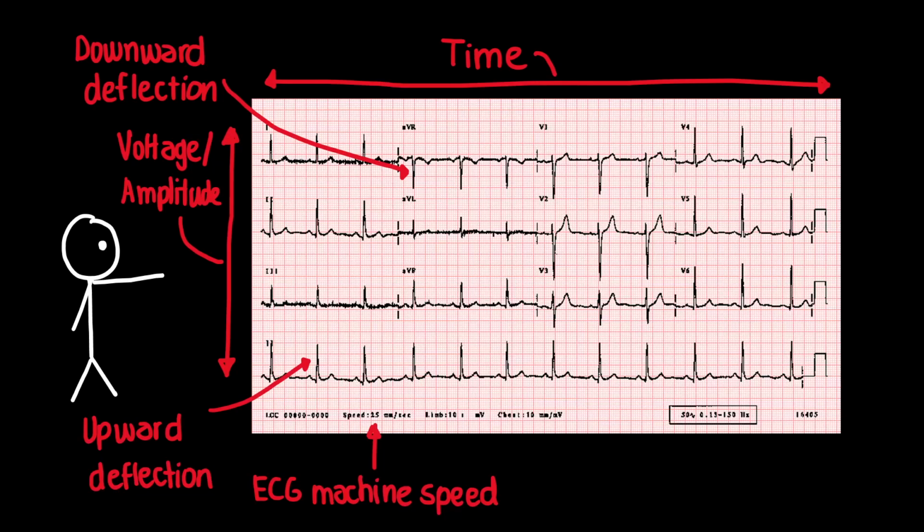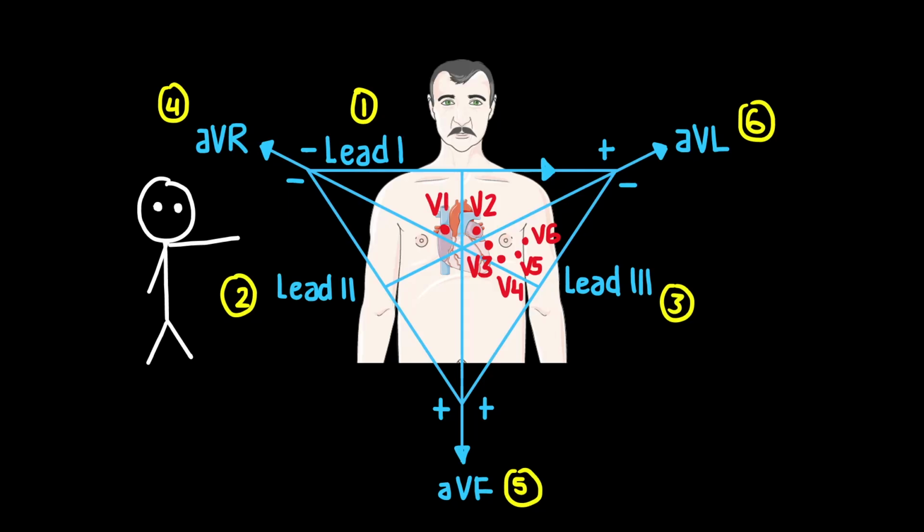But here's the thing. We've been talking about the paper, the recording. We haven't yet talked about who's watching from where, which lead is sitting where on the body, what angle each one is looking from, and why that matters for everything you'll read.